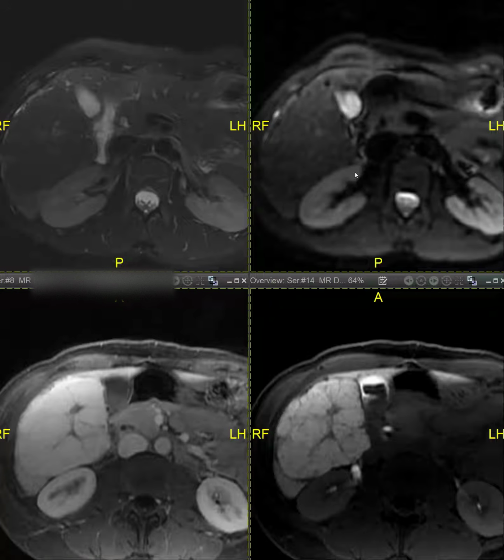If you scored it as retaining contrast, it will go into those 20%, but you do not want that. It's not just retention of contrast with EOVIST, it's relatively uniform retention of contrast with the exception of these septi, which FNHs have.